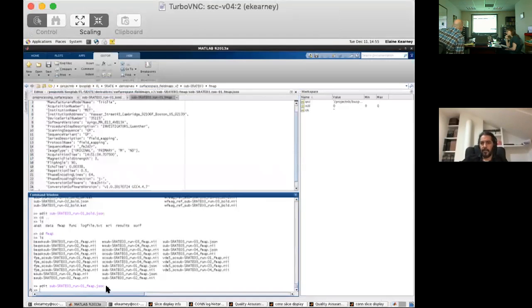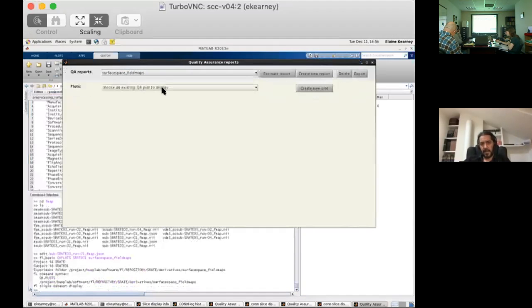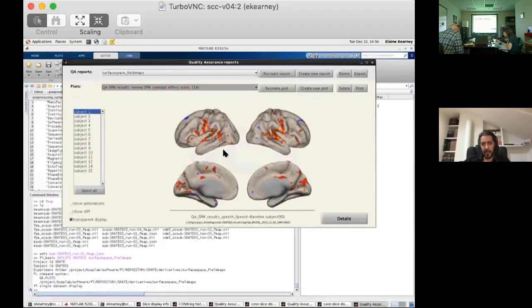It's interesting. Those look pretty good, except for those first two subjects, and one in particular where the activity is shifted back. A lot of what is happening with this unwarping has to do with what's happening in the more anterior sections of the brain. I think the correlation is pretty good between functional and structural in the middle sections of the brain, like speech-related areas. Probably it's not that affected by what we are doing right now, but this affects how good or bad the data is going to be in other areas that we are also perhaps interested in, but they are not as obvious in the main speech minus baseline contrast, right?